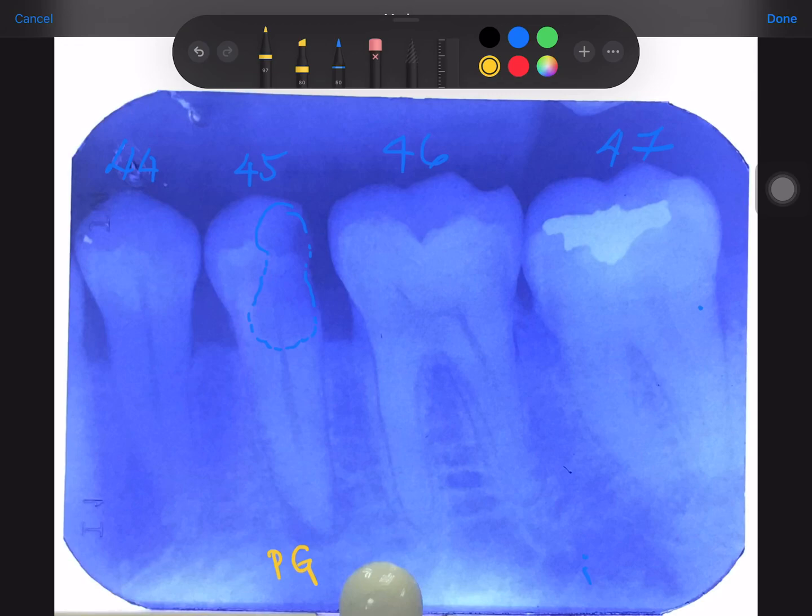It's the mandibular premolar region, root apices. Oh, mental foramen. Excellent. It's the mental foramen. That's what it is. Depending on how the X-ray is taken, it should lie somewhere in this zone. So that's about it.